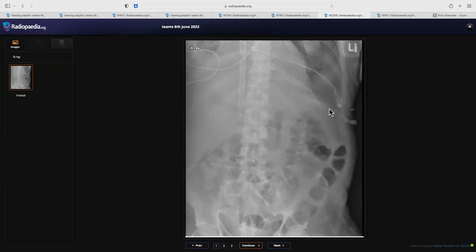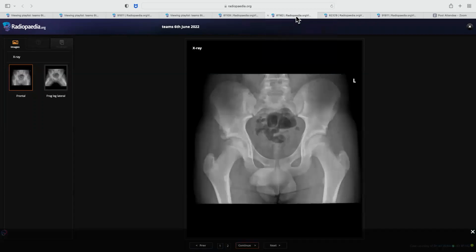The only thing expected in this case was the deep sulcus sign, which eventually you told. This was an edge-of-the-film kind of X-ray. When we are shown this KUB X-ray, we focus on the kidney region, the bowel, the bladder, and we look for abnormalities. Then we look at hepatomegaly. We forget about the deep sulcus sign, because commonly we see this in supine and portable films. When there is an ICU film, we do encounter such things in routine practice, and it commonly comes up as a rapid reporting case.